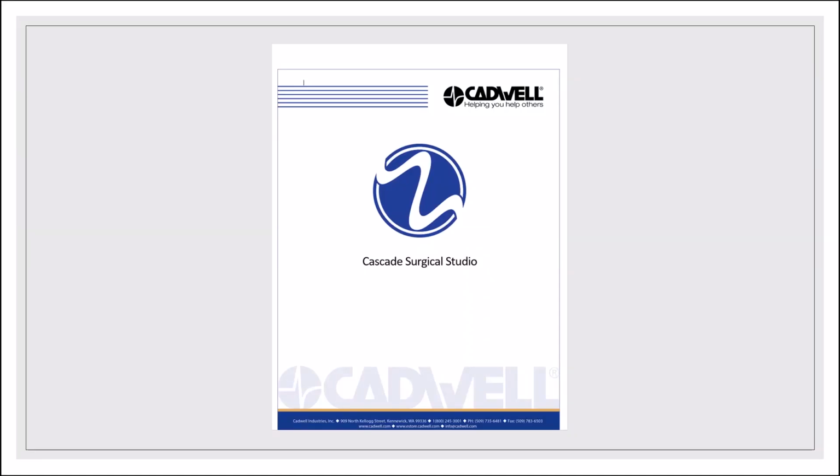The Cadwell Cascade Surgical Studio CadX simulator is a sophisticated tool designed to solve a common problem in intraoperative neurophysiological monitoring. Training outside of the operating room is limited, and many operating room scenarios occur infrequently, but it is vital that the neuromonitorist be able to quickly identify, troubleshoot, make changes, and if necessary, relay the information to the oversight physician and/or the surgeon when these changes do occur in a professional and timely manner.